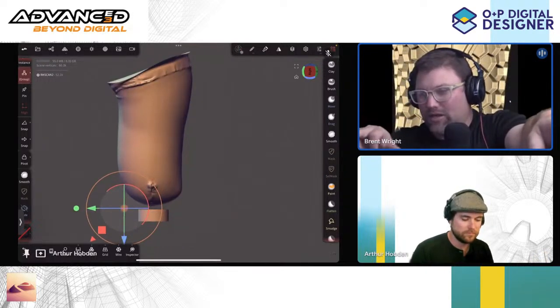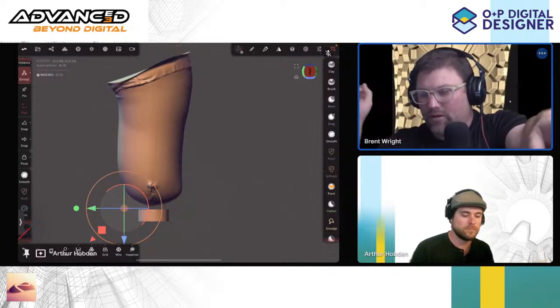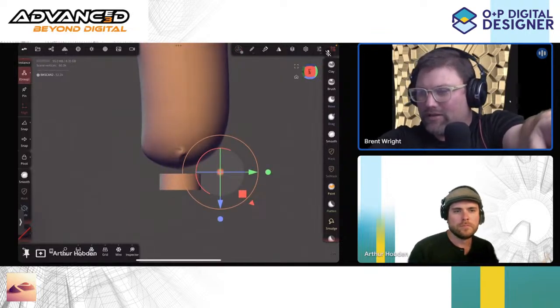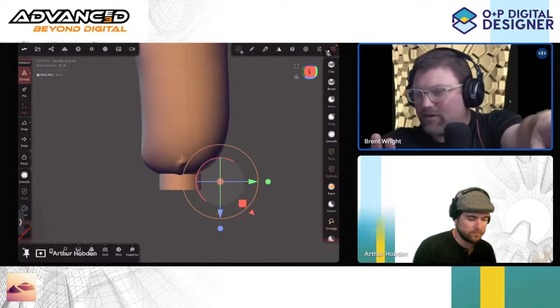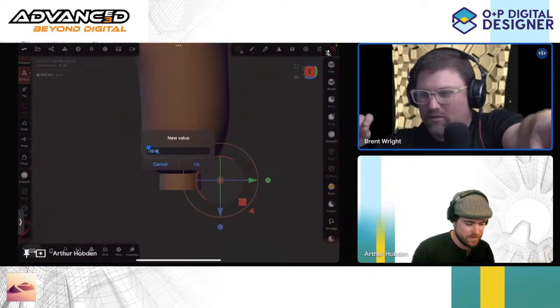What I do here, because we do some little tricks in our automation, is I bring it down and let the distal end go inside. Take it up just a little bit, down just a hair, and I think you're going to be there.